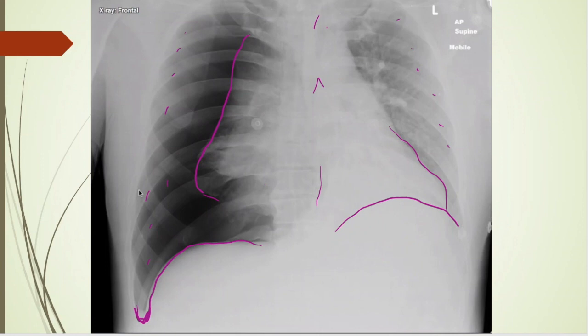So this patient obviously needs an emergent chest tube, needle thoracostomy needs to be fixed like real quick. And all this pressure is what's making this left lung small as well, lowering the volume. There's just so much pressure, you just can't get it inflated very much. I would imagine this patient's probably hypotensive and so forth.